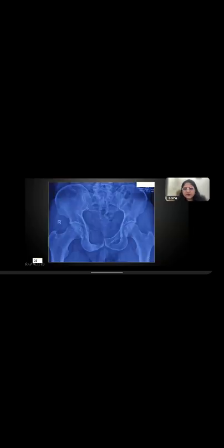Now, this case number 25, I want you to answer what is the abnormality. Case number 25. Right superior pubic ramus GCT, says Falak Dhaka. Great pickup. And thank you so much for answering so quickly because I know we are tight on the time. But this is the important thing that you have to pick up.